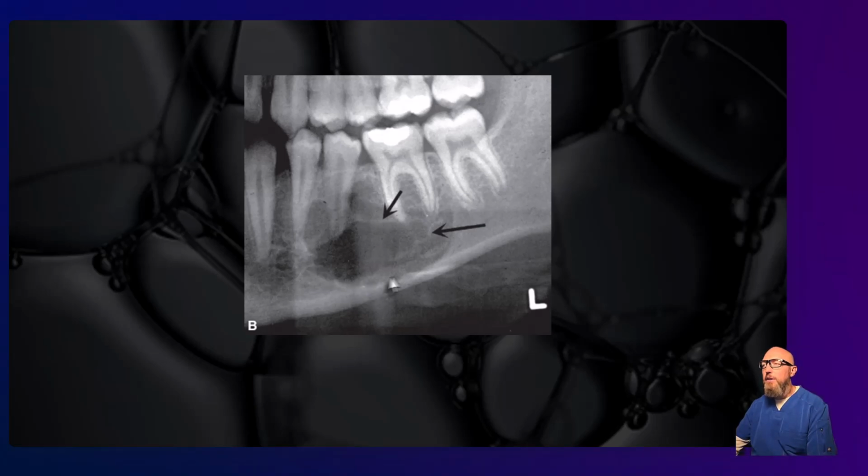This is just anterior to the first molar. If we knew the age of the patient, they look fairly young. Now, this patient could be 20 or younger. And so a CGCG. What's the second thing I said to have on the differential for CGCG? I always think aneurysmal bone cyst as well. Tend to be even more expansile, maybe more posterior, but this is posterior enough that I'd probably consider it. And so those three things I like best about this one as far as the differential: CGCG, myxoma, aneurysmal bone cyst. And that's a really good differential for what you see here.